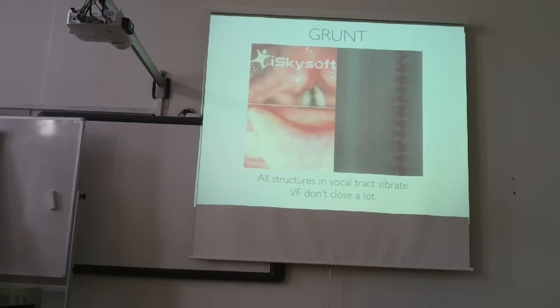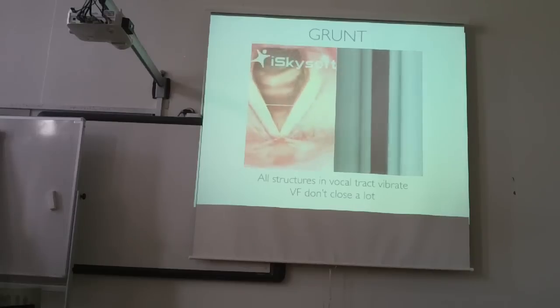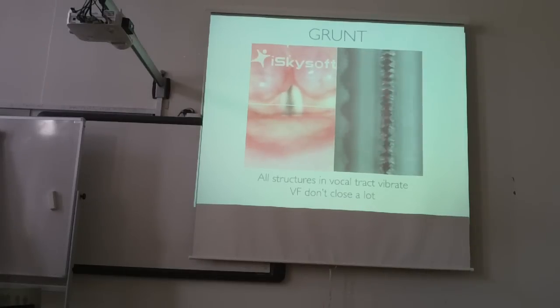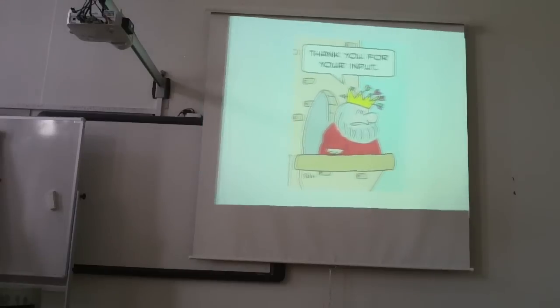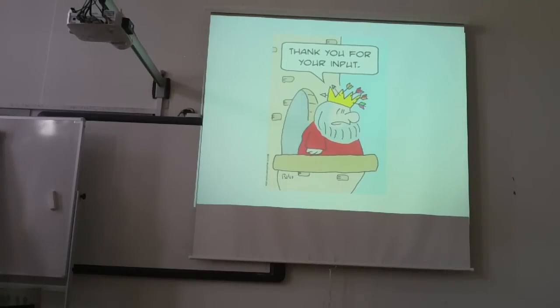This is the last one. Yay! I'm so happy with this picture. Grunt. So, now I'm very interested in your questions and inputs.